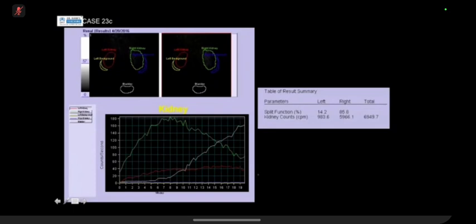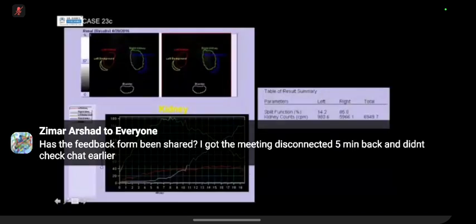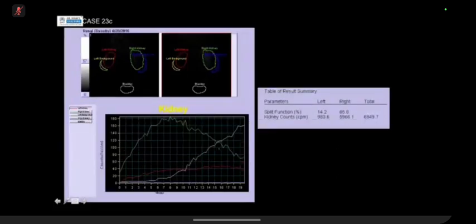But if they continued the graph on, as they did with the delayed static images, to about 53 or 56 minutes, there would have eventually been some drainage of that kidney. So in my institution, we tend to do a delayed image after 30 minutes to see if there's been any drainage. Some places don't, but we tend to do that. And so if you had drawn that out, you'd have called it sluggish drainage rather than true obstruction.